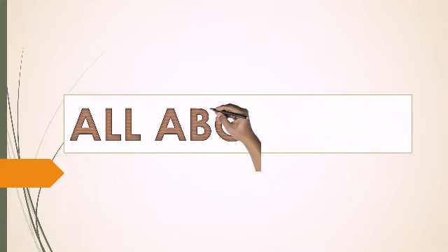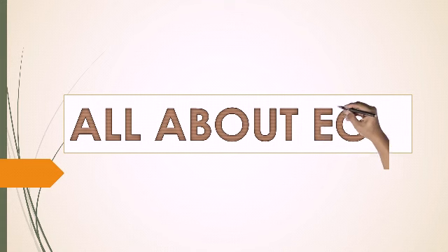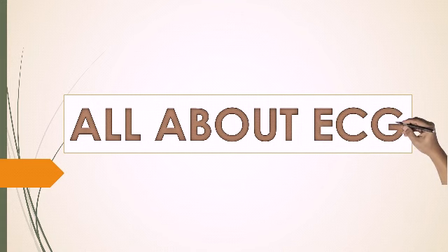Good, let's see ECG recording. In this ECG recording, we are going to see the electrodes placement and we are going to see what we call leads. So there are three terms that we have to know before we see ECG recording.